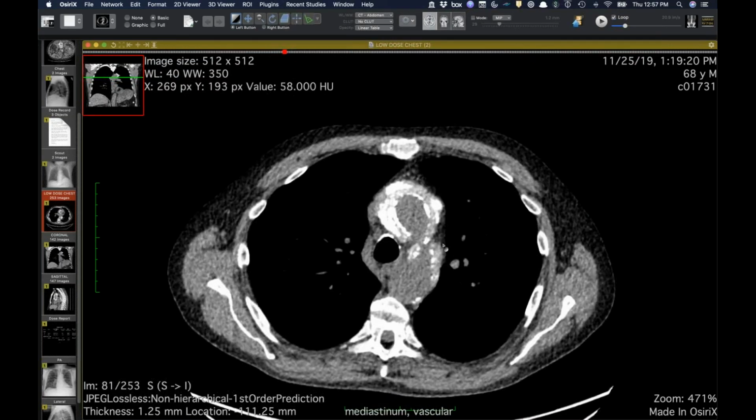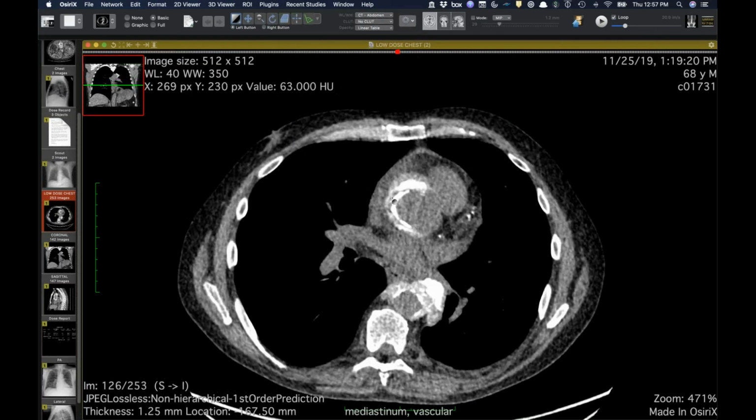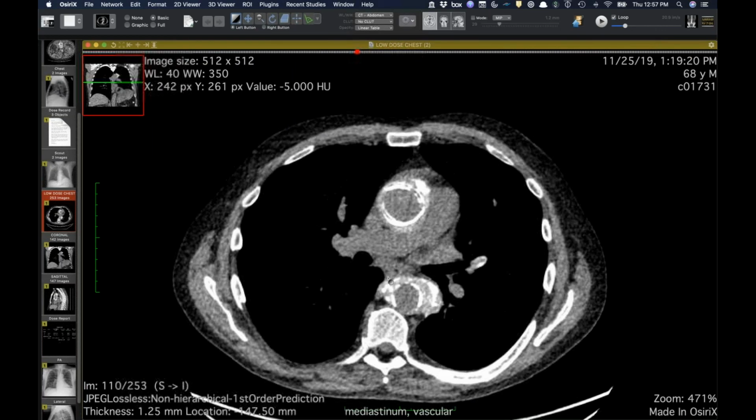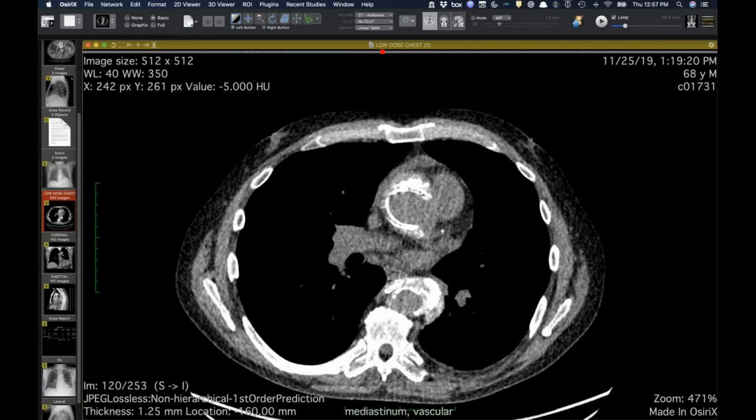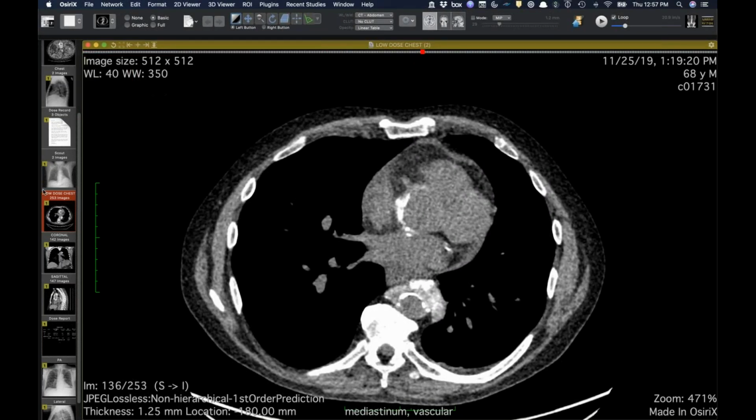Well, at first I thought maybe it's syphilis, but then with the abdomen, that doesn't quite. Yeah. It's like milk of calcium, or a chronic, an old injury or like an old dissection, but that doesn't look right. Erdheim-Chester, that doesn't look right. Right.